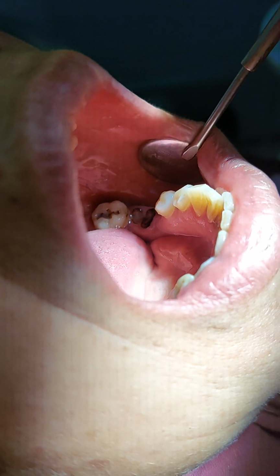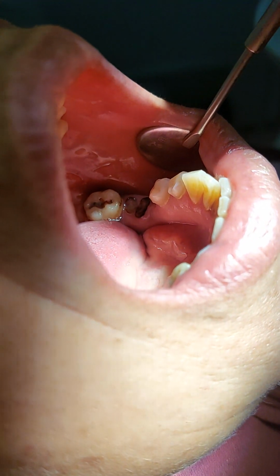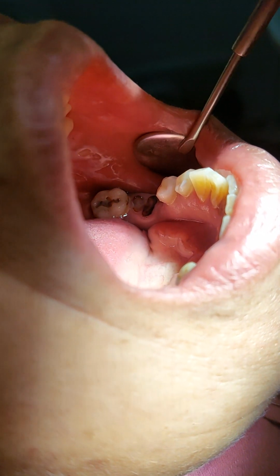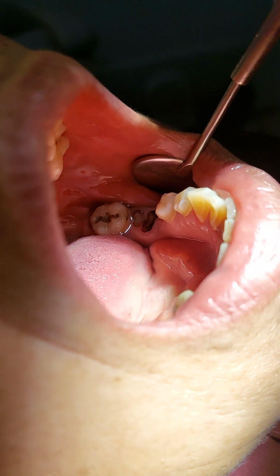So you said 7? And you said 8. Okay, what made you say 8? Based on the anatomy of the wisdom tooth. Anatomy? It looks like a 7 as well. The plus shape, the fifth cusp is not there. Fine enough, this could be a 7, by the way. It could be.